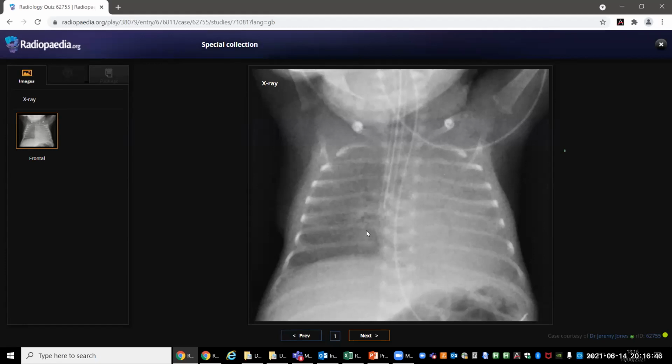But the right lung itself is also not normal. I thought you would have picked the fact that this is a preterm from the beginning of your introduction, that this is a chest radiograph of a preterm neonate, and that is the clue that this is RDS. So very well done. Thank you very much.